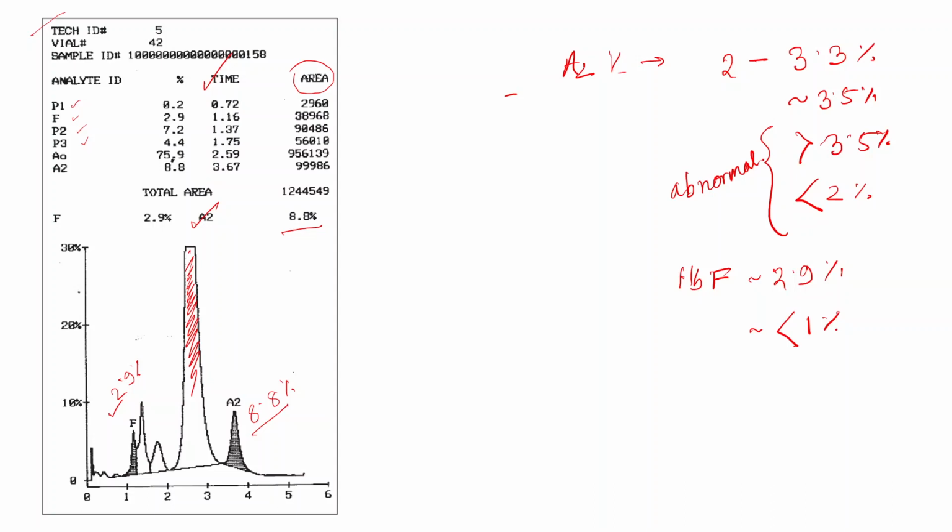So, how to interpret this HPLC curve? In a normalized approach, you should first look at the HbA0 percentage. If the HbA0 percentage is more than 50% or so, this can never be a homozygous hemoglobin disorder. So, if HbA is present in a significant amount, first you have to know that this is something heterozygous.